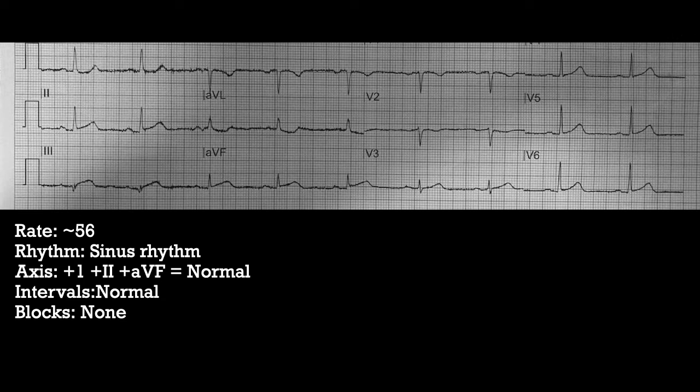Looks like it's starting to get just a little bit of maybe elevation there in the ST segment. No flipped T waves, but maybe a little bit of elevation there. It can sometimes hide a little bit. It's under a millimeter, it looks like. Those are, again, looking at the precordial leads, V1, the V leads essentially.